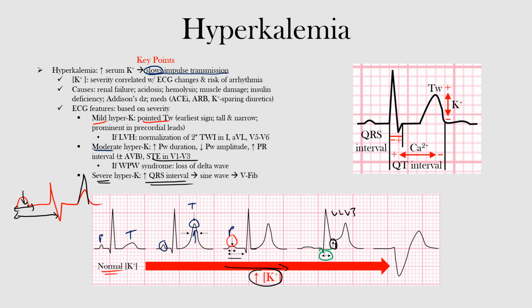Notice it's getting wider. This is our QRS interval. We're saying that it's going to get prolonged. So, widening of that and more prominent features of the P wave. Notice here's our P wave getting even wider and flattened in this case.